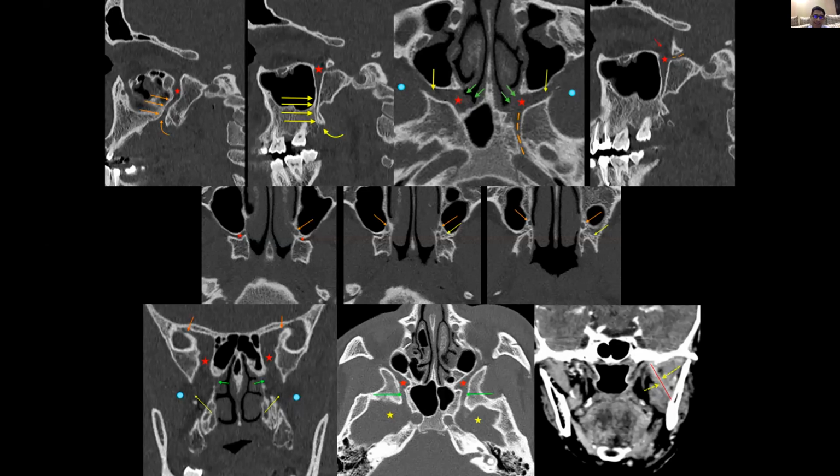So this is a classical example of a perineural spread, a thickened band-like structure which is seen extending from the mandible, from the mandibular foramen, reaching up to the foramen ovale, a thickened band structure. This is running between the two heads of the pterygoid. That's the lateral pterygoid. This is the medial pterygoid, a classical example of mandibular nerve perineural spread.